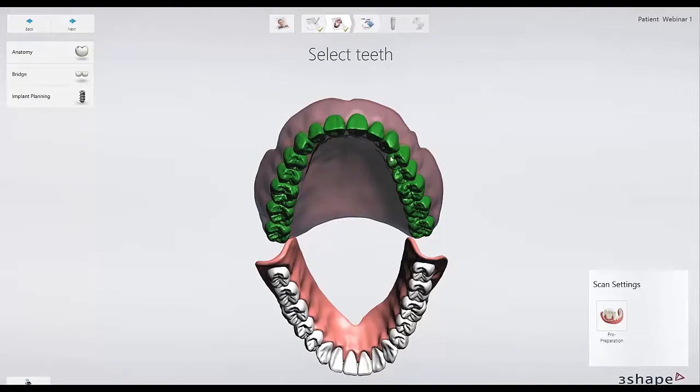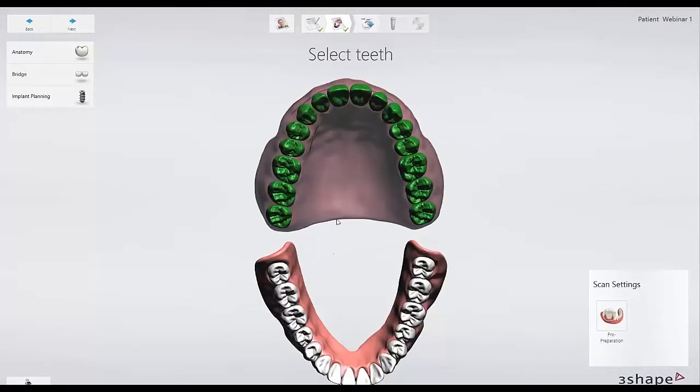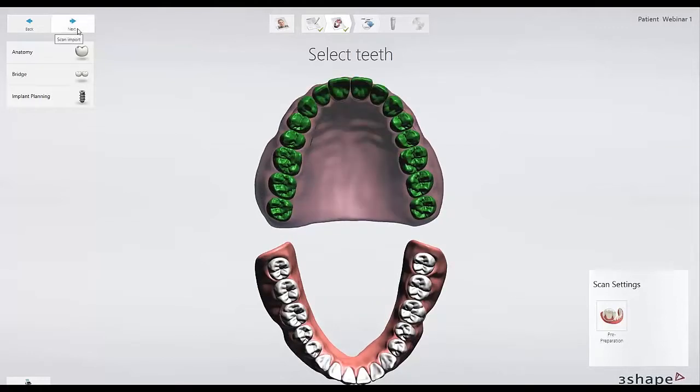Yeah, it's kind of a free mode, in comparison to the tooth supported, where for each individual tooth you should mark where you want to place an implant. Exactly. So perfect. So the order is prepared. The next step is to load in the data sets.